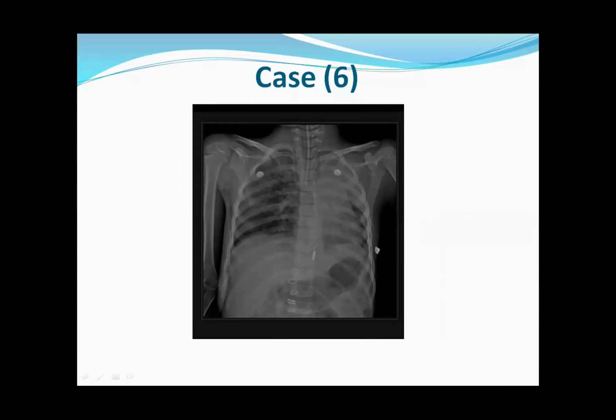A frontal radiograph of chest which shows an endotracheal tube in situ. The tube is reaching just up to the carina, which is slightly lower than the desired position. So the endotracheal tube has to be retracted by 2 or 3 centimeters. Yes.